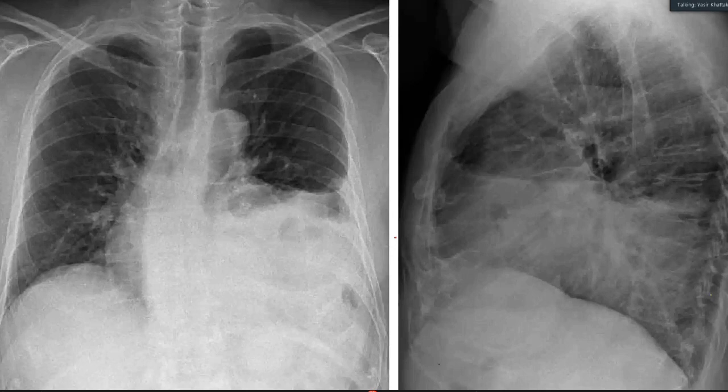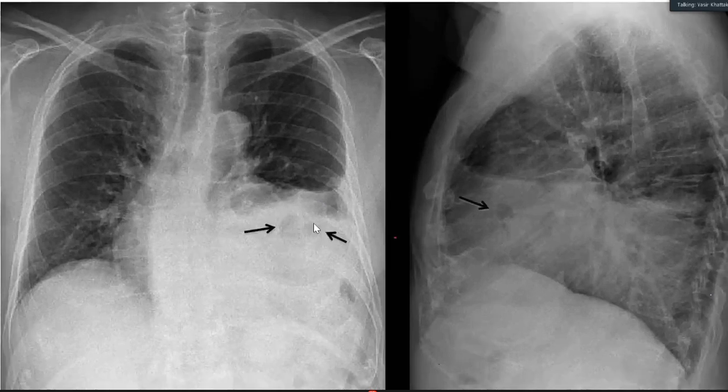Remember, a pathology that you see above can come from below. This is why I'm showing you another case. You see there are abnormal lucencies. There is opacification. The left lung appears to be compressed. There is blunting and a slightly irregular margin. You see sort of lucencies there. That lucency is either because of necrotizing pneumonia, or a trapped lung, or because of some bowel.